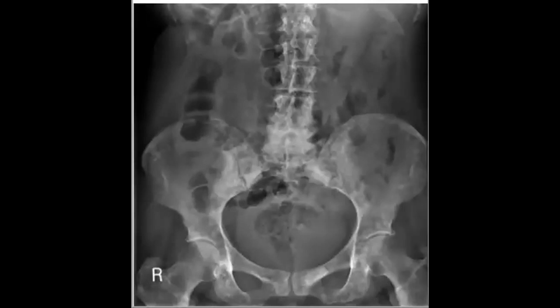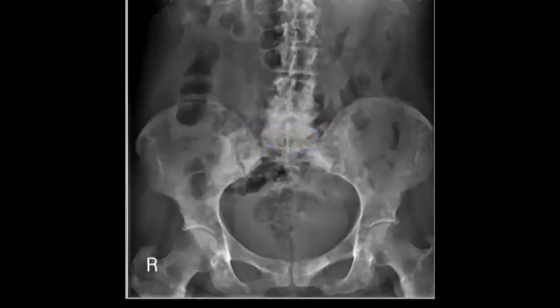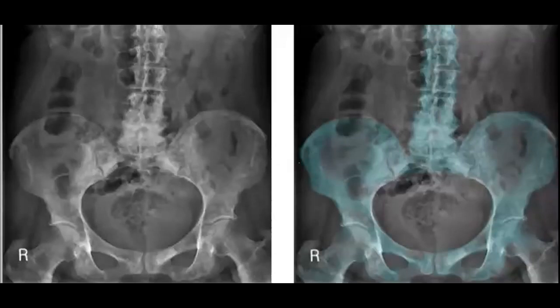Ivan, nice. So what do you think about here? Yeah, sclerotic metastasis, multiple, numerous sclerotic lesions all over. If this patient is male, you'll think about prostate. If female, you'll think about breast. Exactly.